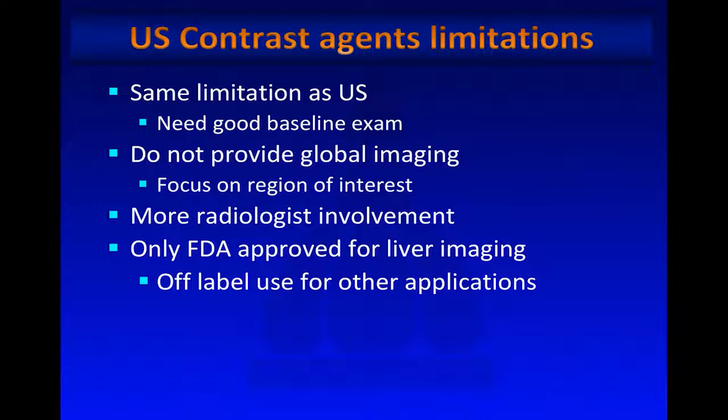The other thing is, it does not provide global imaging, so you need to know what you're looking for so that you can focus on the region of interest. Having said that, in the liver, the contrast is around for several minutes, so once you have evaluated your target lesion, you can look at the rest of the liver.